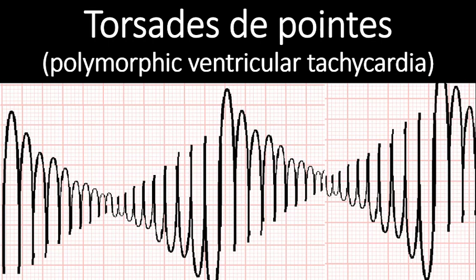So this is turning of the points, and it might not be nearly as painfully obvious as this is, but this is torsades, and it has to be treated a little bit differently than VTAC, because this will sometimes look very much like VTAC with very subtle changes.